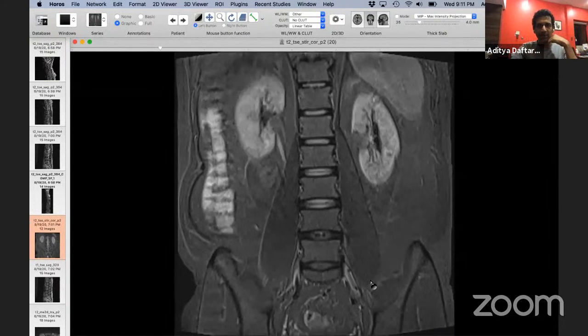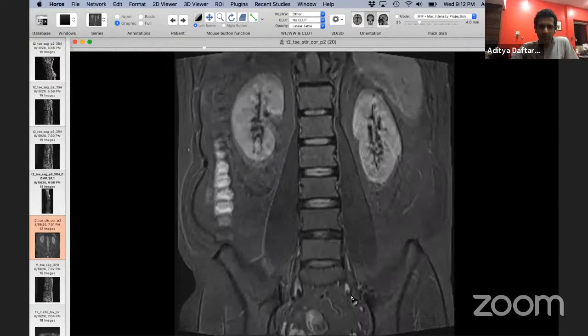You can see the abdominal viscera. And sometimes you can see down, especially in females, you want to look carefully for things like uterine masses, cysts, in males, prostatomegaly. These are things that can sometimes become important. Oftentimes we go down and look at the hips as well, and it's not unusual for us to find a patient where you're thinking about L3, L4 radiculopathy and they have hip pain, and you find that the person actually has a subchondral insufficiency fracture or something in the hip, which is important.